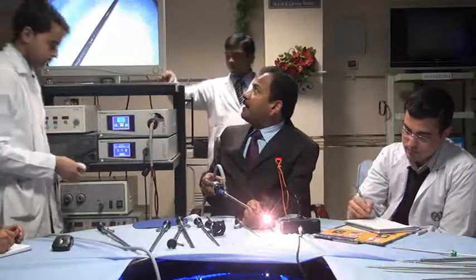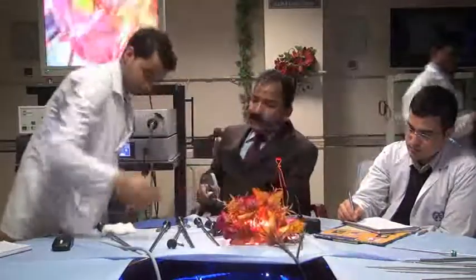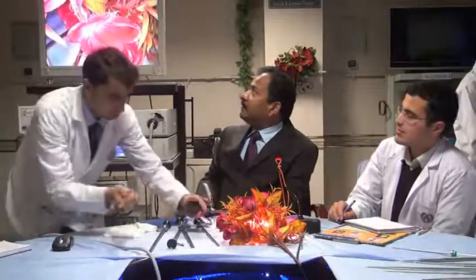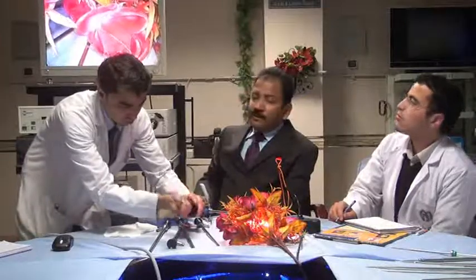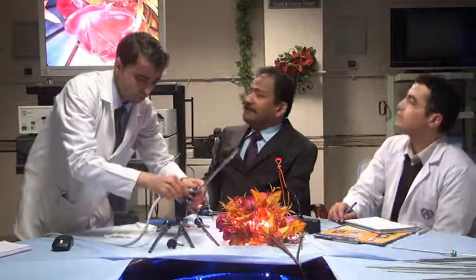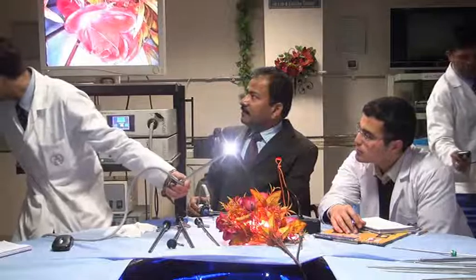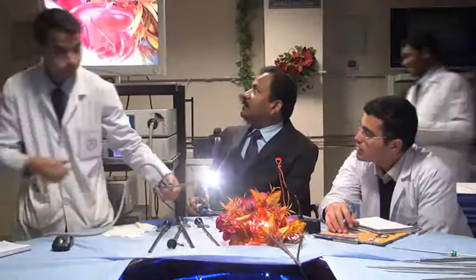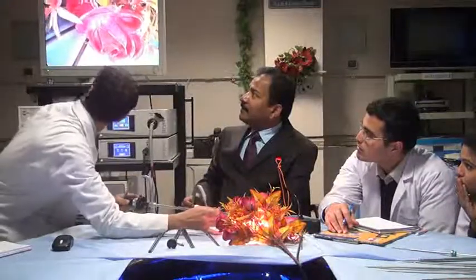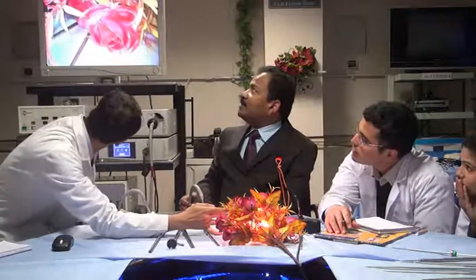So red color layer. And now we will put a red rose here. Now see now. Now you will see the quality of the image in between these two. This will be single chip and this will be 3-chip. One is 3-chip, other is single chip. Do you see the difference now? Now the difference will be visible.